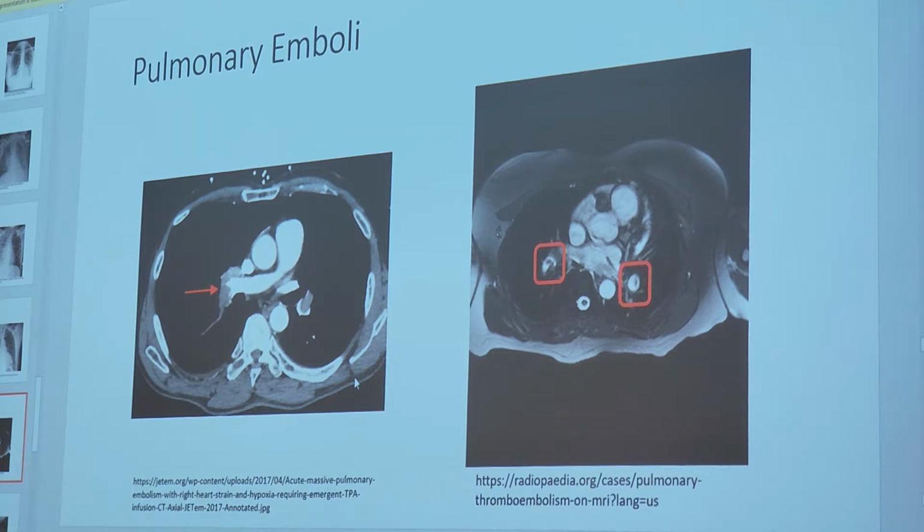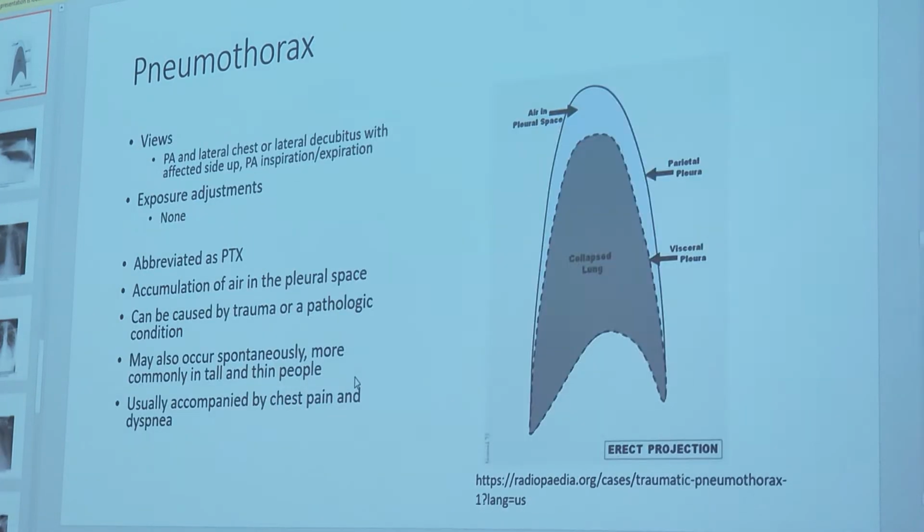Any other guesses for the lordotic? Why do we do this? What pathology do you want to see from the apex? A mass, a tumor? You have some dots here in the apices of the lungs. A tumor. Yes, tuberculosis. Specifically, secondary tuberculosis.